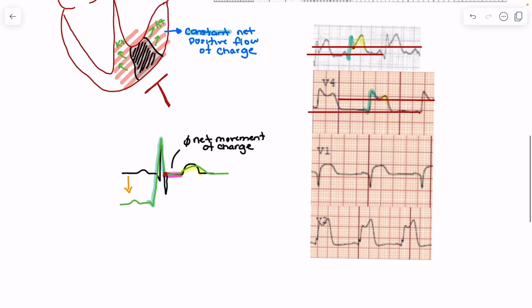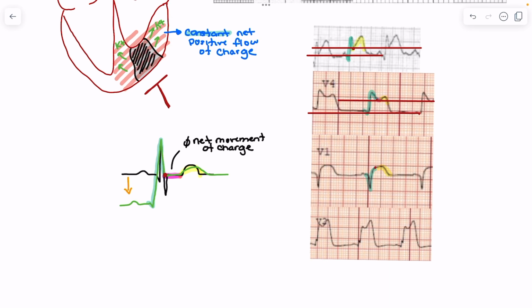If we do this again on the next rhythm that we look at here, we can see negative deflection from baseline, positive deflection from baseline on our QRS. And here, again, we have to be careful in recognizing the T. So this is our T wave, and you can see a very small little dip here where we're kind of moving up. So the J point is here, where we can see we're moving in the positive, kind of concave direction, followed by a slight change to convex here, and that is where the J point is. So we're looking again for that change in deflection. If we map our lines out again, we can measure the distance, and that's what's going to tell us how much elevation we have.